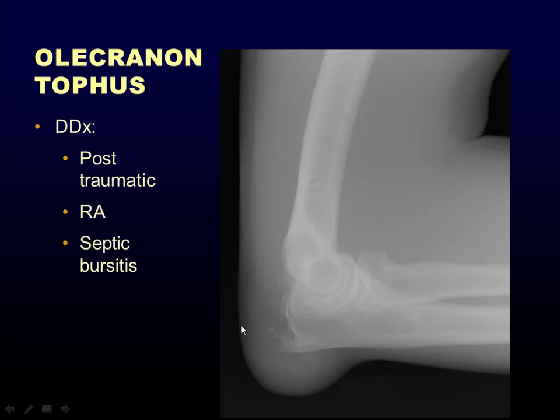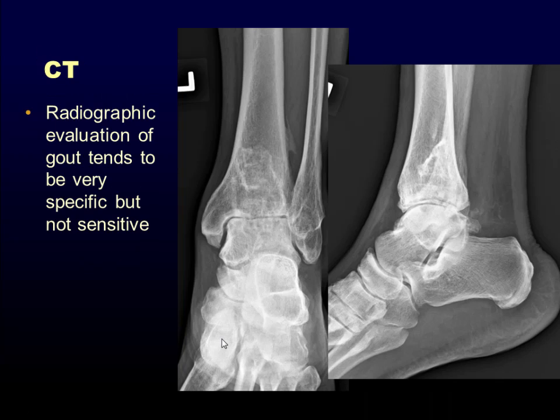Like rheumatoid nodules, gout is in the differential for an olecranon bursal enlargement. And when it does break into the joint space, it can produce some pretty unusual appearances of sometimes large cystic changes that may look like a hemophilia or some type of bone tumor.